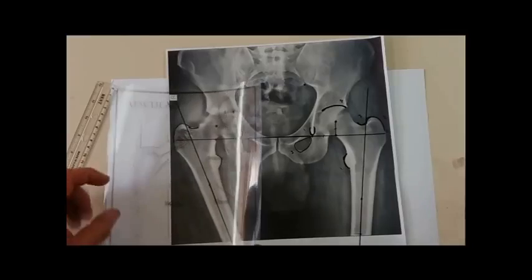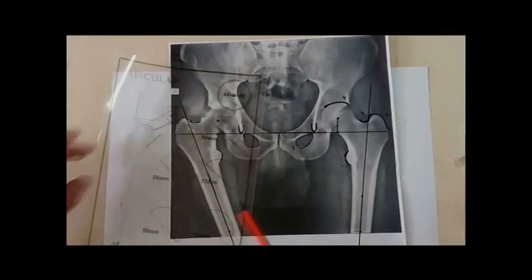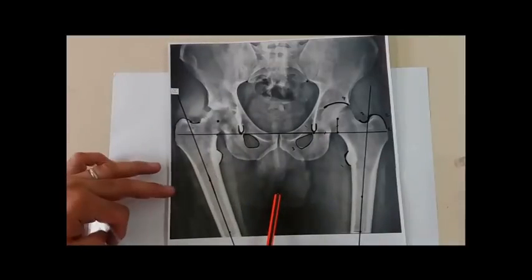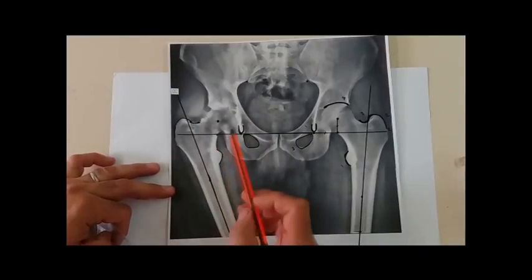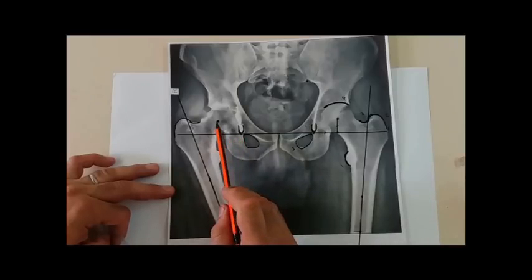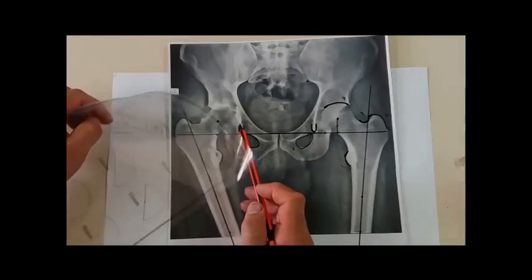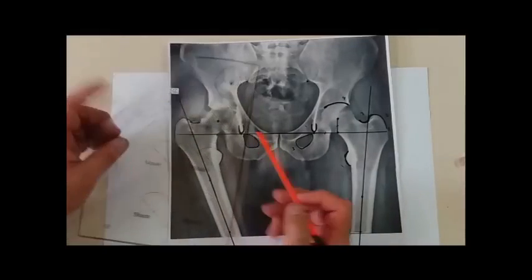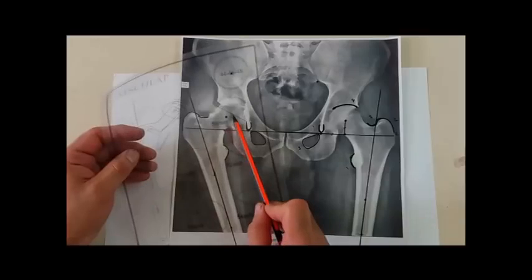To start with, I should fit the implant of the acetabulum, the acetabular component of the total hip. How can I fit this implant properly? There should be certain criteria to verify that it's perfect. Just a rapid look through the template of the acetabulum.